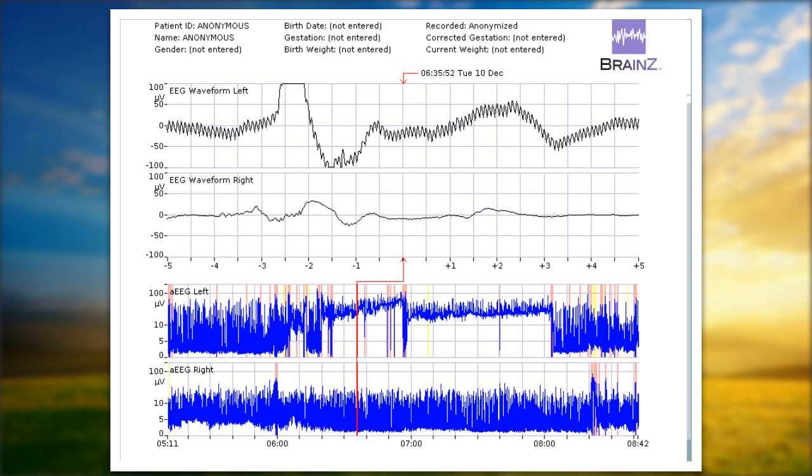But again, because that bandwidth is so thin, it's because that high frequency artifact on our EEG is so similar that you're actually seeing that bandwidth get so narrow there. But all of that is just artifact, and the only thing you can really interpret is what you're seeing on the right side there. So definitely we see this a lot, and it alternates.